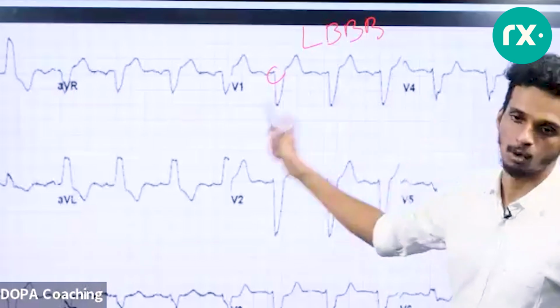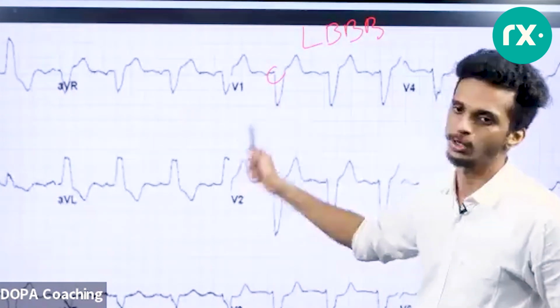And if they're not there in their old ECG, this is a STEMI equivalent. You should refer this patient.